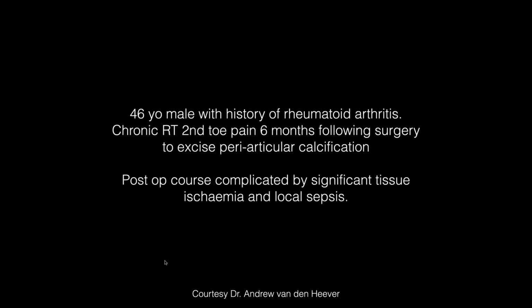What I always found interesting is that you name a position of a bone in a foot or hand or whatever in rheumatoid arthritis, and you'll find all kinds of different defects. Yeah. It's amazing. It's like what this disease can do, and everything that it does is miserable. Yeah, right. Ashu, what do you think of this one?